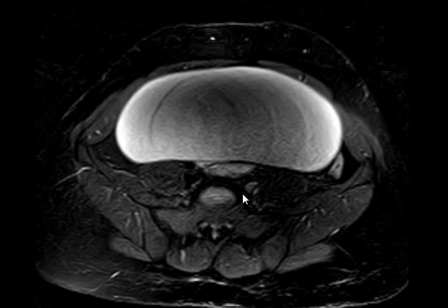However, there is none. What about if it's from the pelvis going up? What could it be? Cystadenoma, ovarian cyst, exactly, chronic non-functional follicle or things like that. Then, what do you think this was? This is ovarian cystadenoma. Yes, a huge ovarian cystadenoma in a 20-year-old female patient.